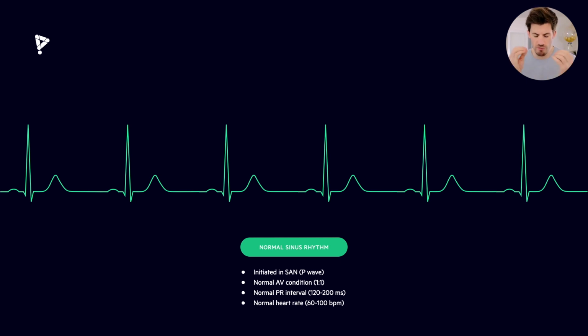One thing really important to take home is you want normal electrical activity being initiated in the sinoatrial node, and you have that 1-to-1 conduction showing normal atrioventricular conduction, 1 P wave to 1 QRS complex.